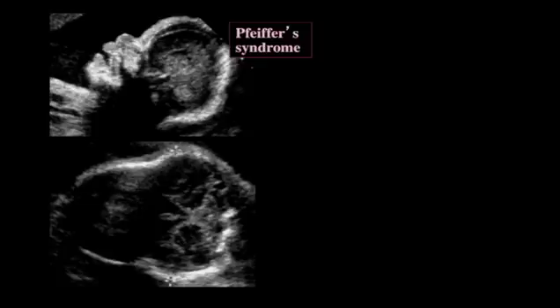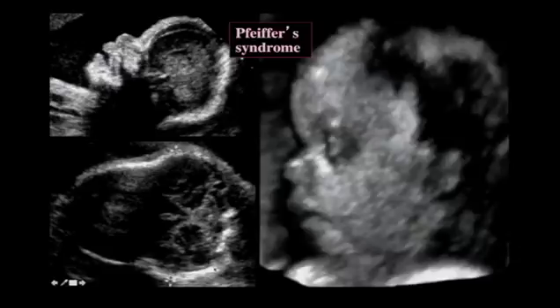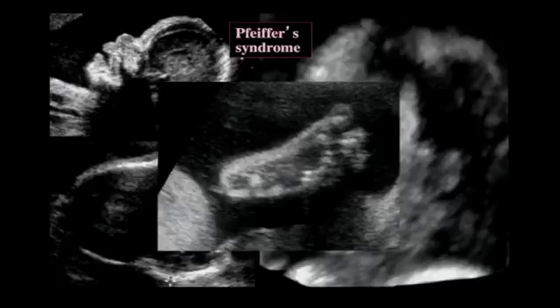Now, going on to Pfeiffer syndrome, that's the one that's a craniosynostosis, and it's associated with fusion of the various sutures, and that's why they end up with a cloverleaf-shaped skull, as you see here. And here is what these look like in 3D. What they tend to have, along with the cloverleaf-shaped skull, is a large big toe, and sometimes even a double big toe. So this is a place to look for your sentinel feature in fetuses with Pfeiffer syndrome.